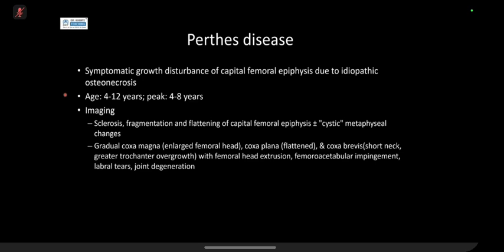Or is it fragmentation of the trabecular bone? Is it some deposition of fibrofatty tissue or granulation tissue because of whatever altered blood flow is within that hip joint? The cool thing is these are actually not very rare, and in literature it's reported that they are seen in a delayed phase of Perthes disease. So it could actually help you to be quite confident that this is Perthes disease. But of course, take it with a pinch of salt, always correlate with the clinical history.